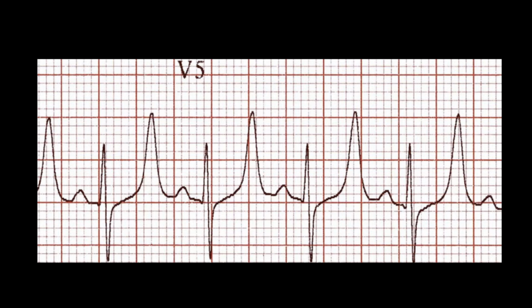So generally we say, well, imagine tying a string to that T wave and then just slightly pulling that string up all the way up until it really gets peaked, and oftentimes is above the QRS amplitude. So as hyperkalemia progresses, and it's common to see these in your dialysis patients who, for whatever reason, haven't made it to dialysis for a couple of days, it's important to identify the progression of hyperkalemia.